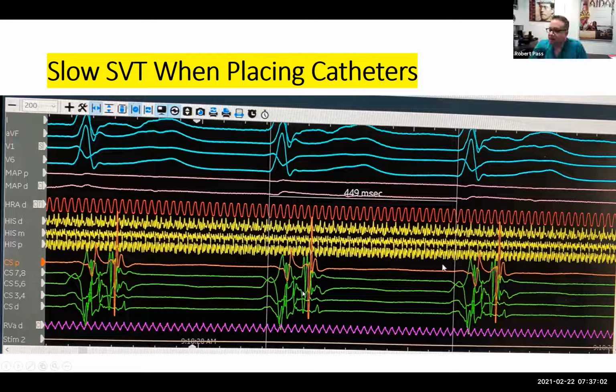Well, coronary sinus. So these are the V, just like you said, and you analyzed this very well, Purna. Very intelligent to look at the surface ECG and go down in your mind's eye and say, well, anything that's simultaneous with the QRS is V. And that's what you said, and that's correct. So these are the ventricular electrograms. And then these are the retrograde atrial electrograms. And I think you would agree that if we look at the proximal CS, that A, which is in orange, is clearly later than the A in 7/8. You agree with that?